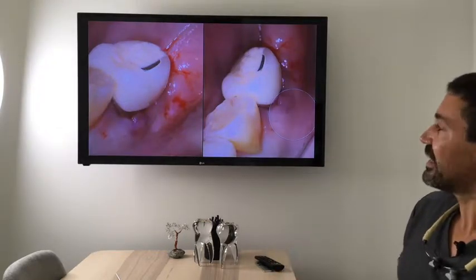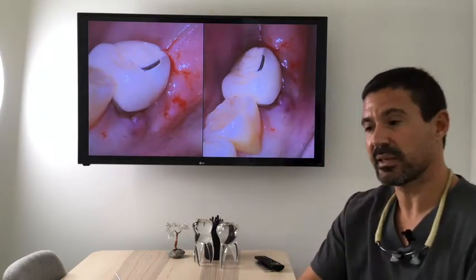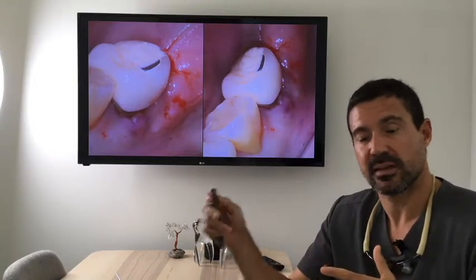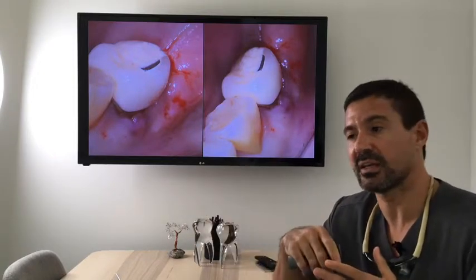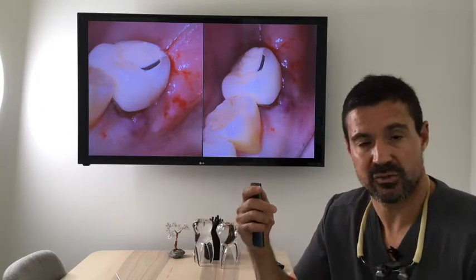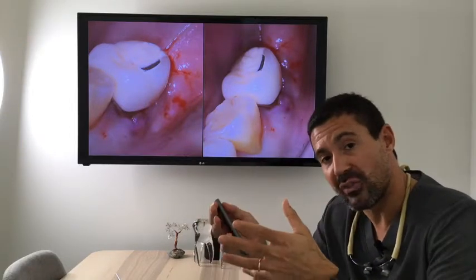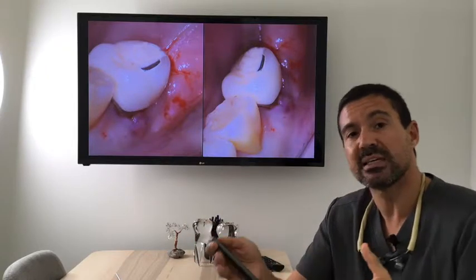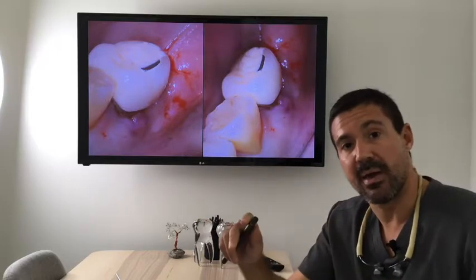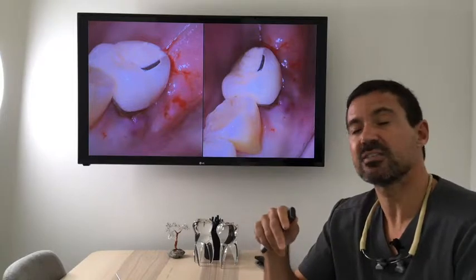And obviously, this is the lingual aspect of the patient. And this is why the CBCT is very important, because when a cyst is draining through the buccal plate and draining all the suppuration to the intraoral area, the patient is going to swallow that drainage of the abscess. But if the periapical lesion or the abscess is draining into the inside of the mouth or the bottom of the mouth, very complicated and very dangerous problems may develop. This is why it's very important.